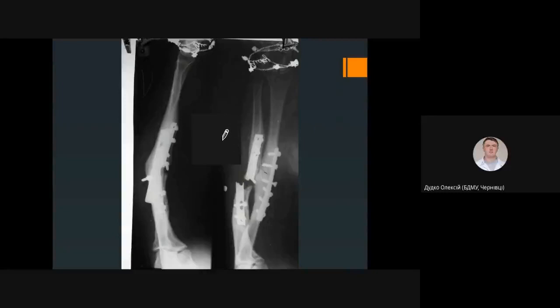And this fracture is with displacement. We actually have angulation. We'll say that that is a varus displacement, as the angle is open to the medial side. And we also have a shift of the distal ulnar bone to the radius side, to the lateral side.